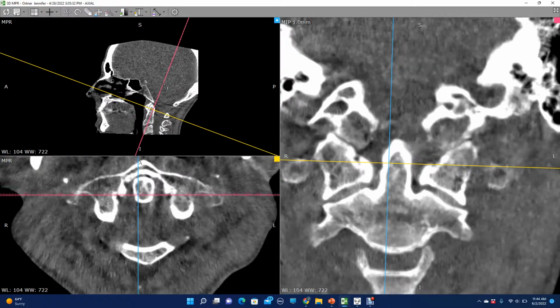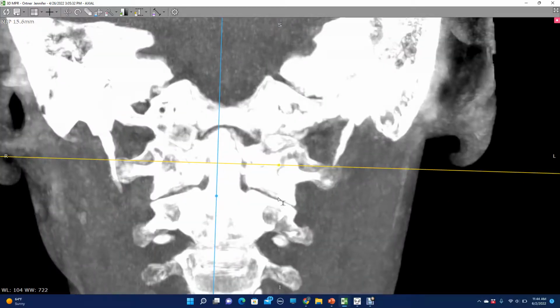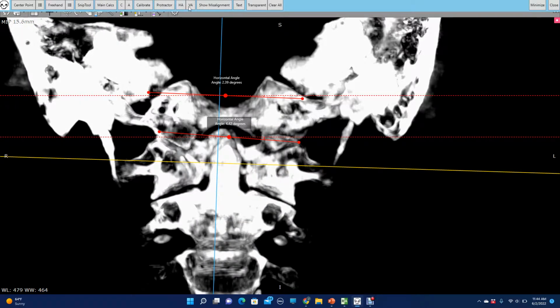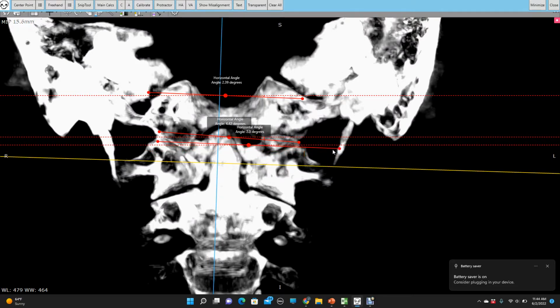And if we look at this atlas like this, where we're looking through the whole chunk of it instead of one slice of it, everything superimposing, we should be able to get more consistent measurements. And I think that's how they got away with this on X-ray. .3, so that's more consistent with the initial one.